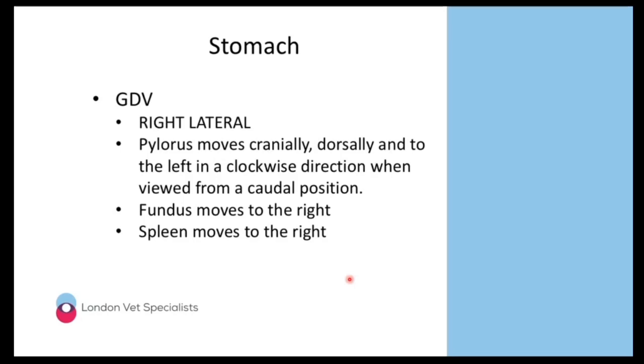So if you have a patient that you think might have a GDV, then a right lateral radiograph is certainly the way to go. And you can diagnose a GDV very confidently with just a right lateral radiograph. You don't necessarily need to get into doing VDs.